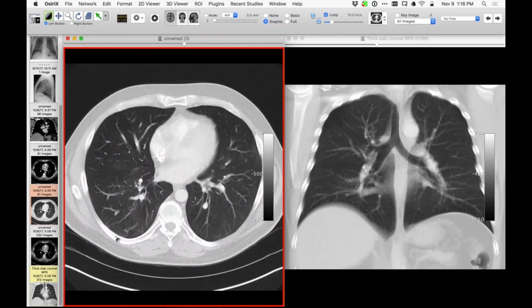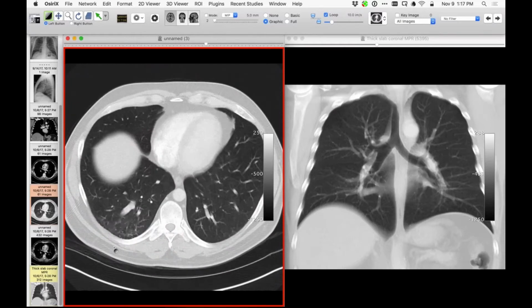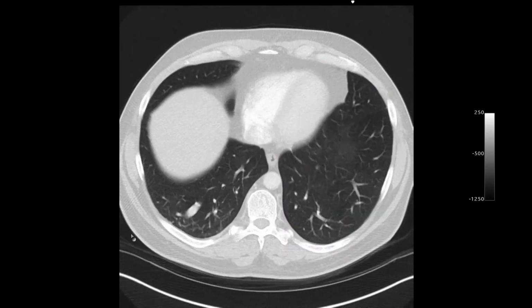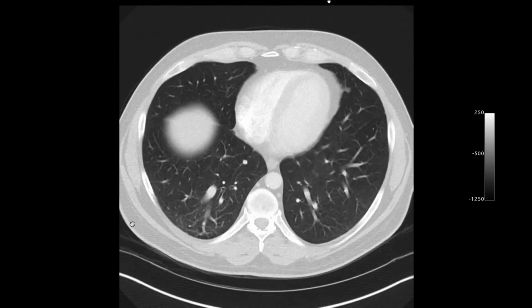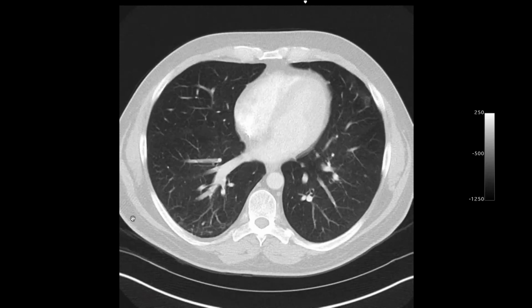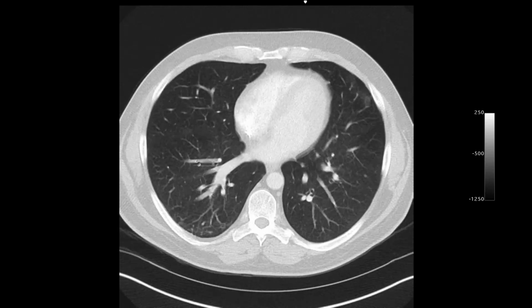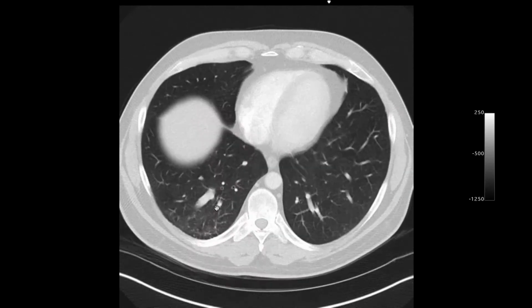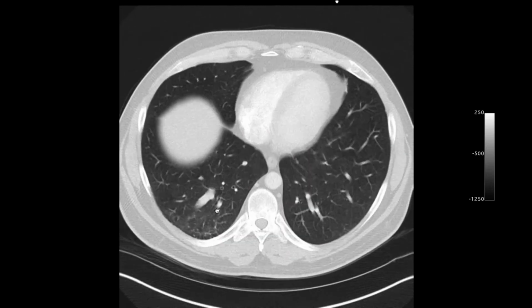There was a second big branch back there. Yeah, it looks like sort of the dominant vein down there. There's somewhat fewer veins on the right than the left, but it goes all the way out to that pleural surface. Yeah, that big branch. Yeah, it's interesting. You know, there's some others coming in as well. For whatever reason. Yeah, just a bunch of other veins coming in there, but this big fat guy there. So no particular reason that I can see. Just a fairly impressive big thing.